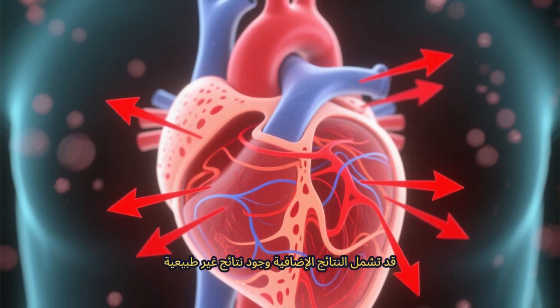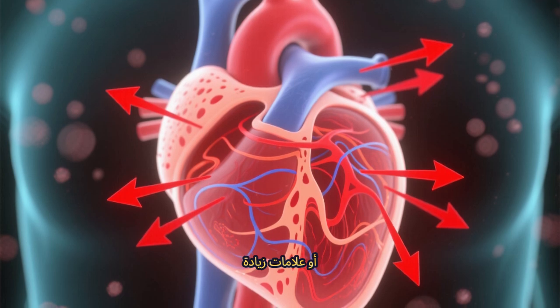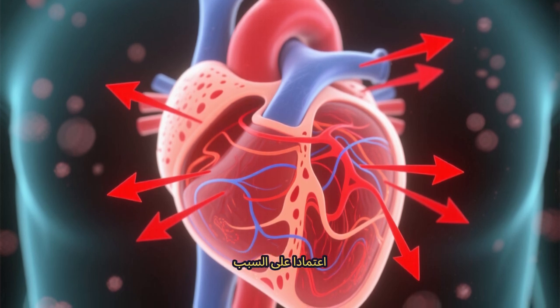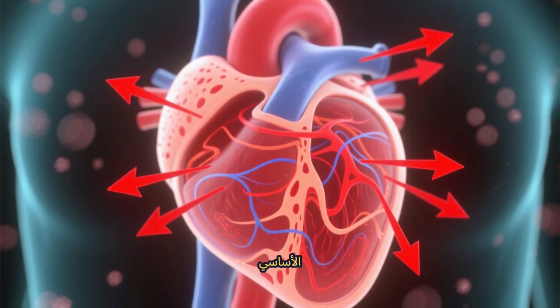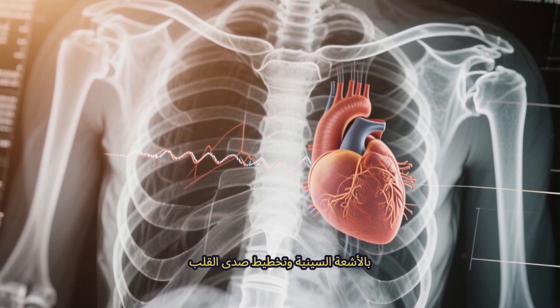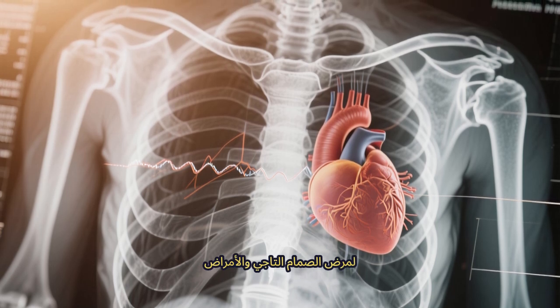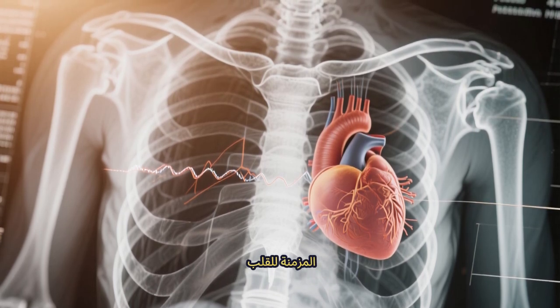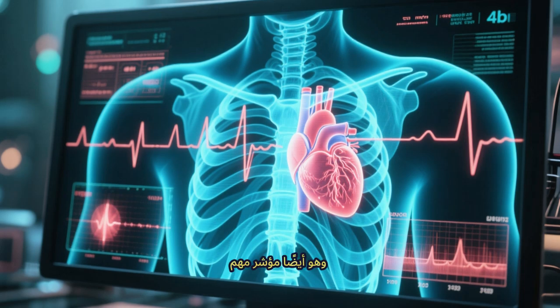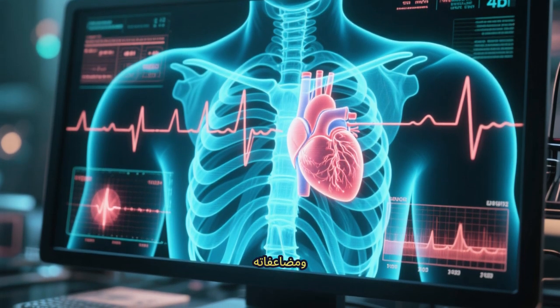Additional findings may include abnormal transmitral flow patterns or signs of increased left atrial pressure, depending on the underlying cause. Recognizing these signs on both chest X-ray and echocardiography helps in the early diagnosis of mitral valve disease and chronic cardiac conditions. Left atrial enlargement is also an important predictor of atrial fibrillation and its complications.